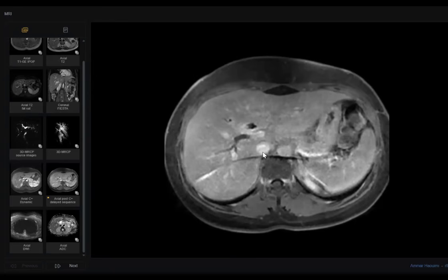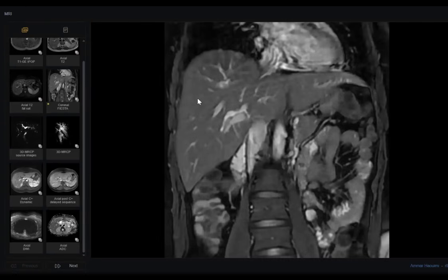So, in this patient who is presenting with obstructive jaundice with dilated intrahepatic biliary radicals, I'm thinking in terms of cholangiocarcinoma. I would convey my finding to the referring physician and would advise histopathological correlation for further confirmation. This is an emergency. I would also advise urgent decompression of the hepatobiliary system by placing a percutaneous transhepatic biliary drainage, and then the patient can be discussed at the hepatobiliary MDT regarding further management.